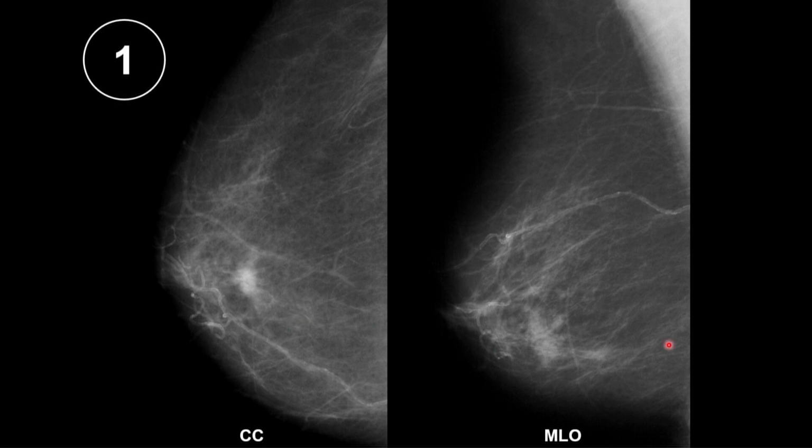Well, let's think about our two-step procedure. It's not deep enough to be not included in the field. Is there any dense tissue that might obscure that? Well, this is your candidate. It's certainly not going to be obscured by the fat there or the fat down there. This is it. So let's look at this and this at full pixel resolution.